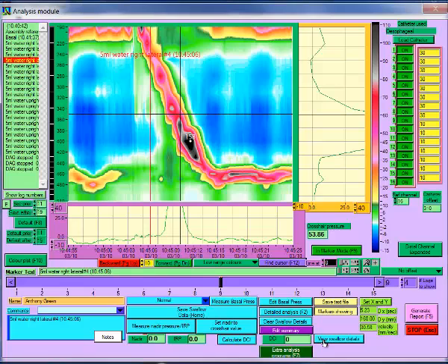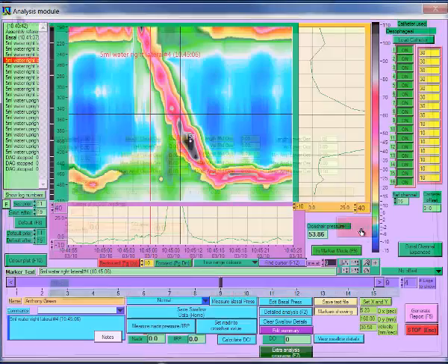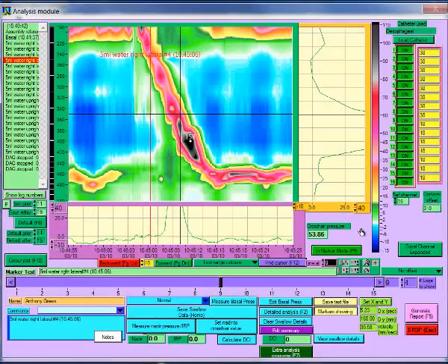This shows all of the data that will be saved for a particular swallow, including any data from the Detailed Analysis screen. To clear the details for the current swallow, click on Clear Swallow Details and all data will return to its default value.